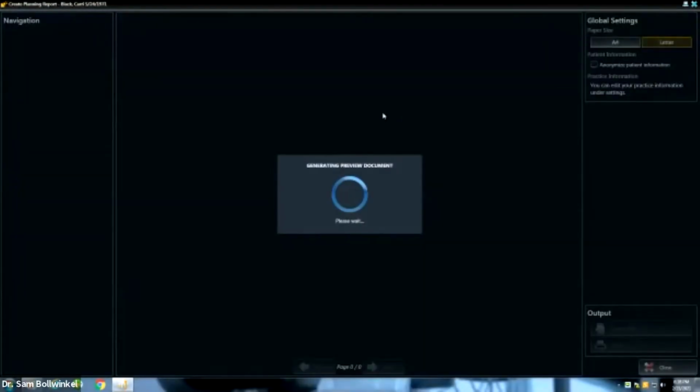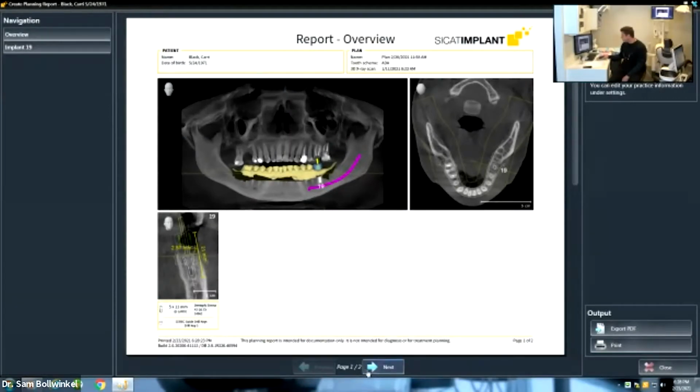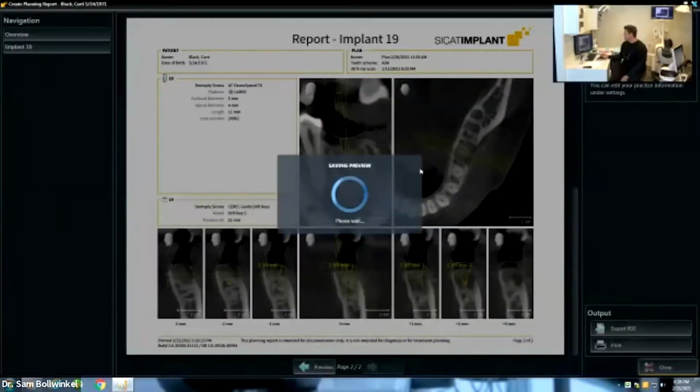So we're going to queue up that information real quick. This is going to put our plan together. A great opportunity. So this plan is then printed. My team picks it up. From there, we export the file.